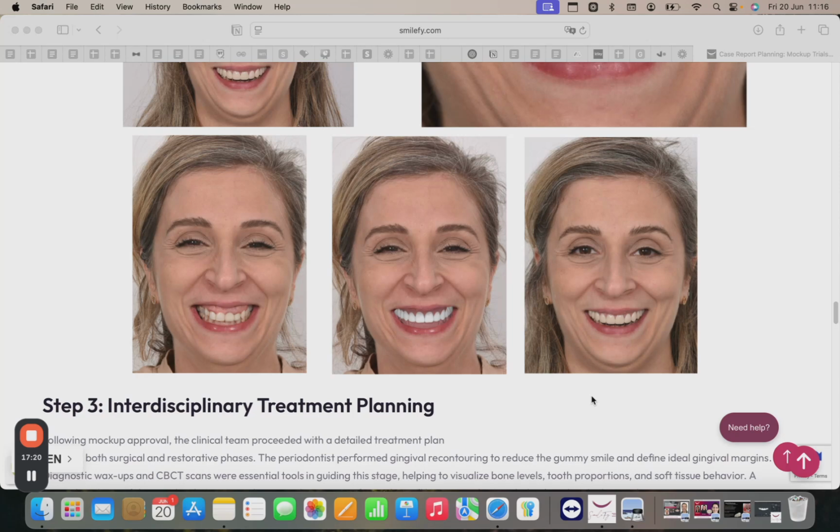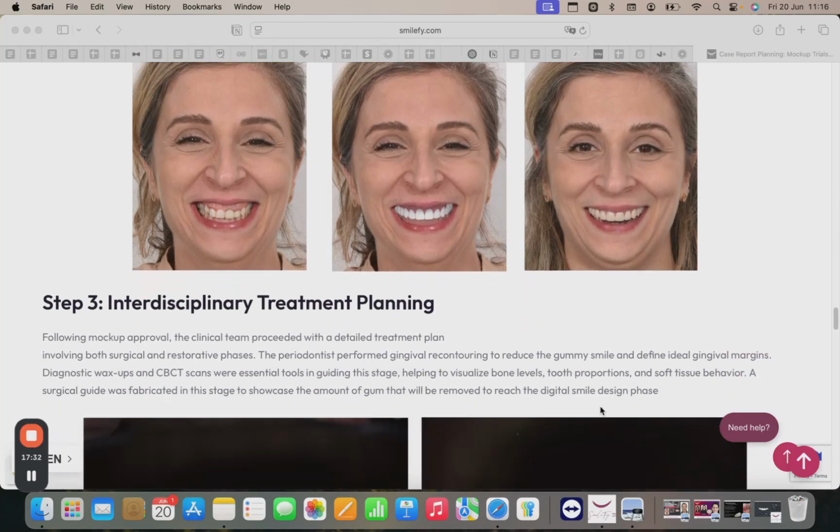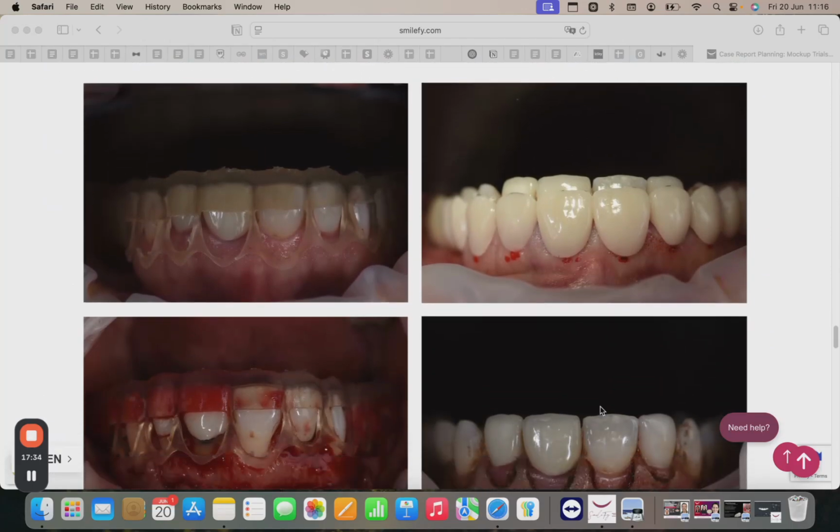Just make sure for the shells mockup that you keep a minimal thickness of 0.4 millimeters for each tooth. So you can check this with a cross-section analysis. Again, we have a video tutorial explaining all of that.